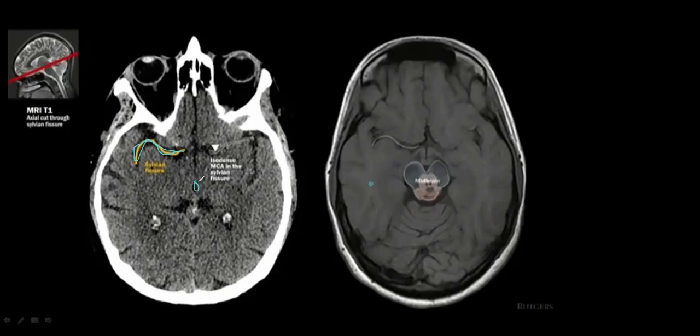What is this? And what is this? And what is this? Anyone?